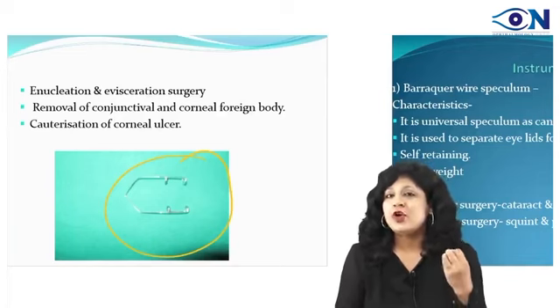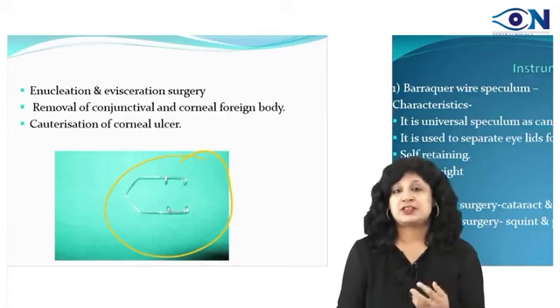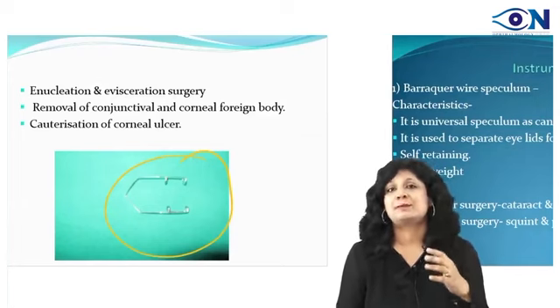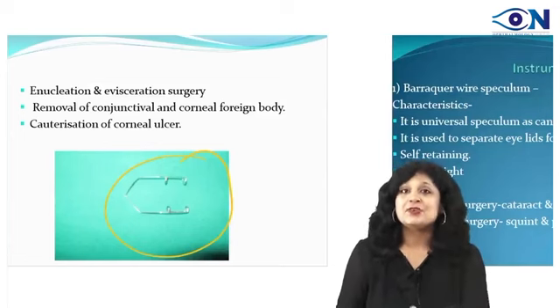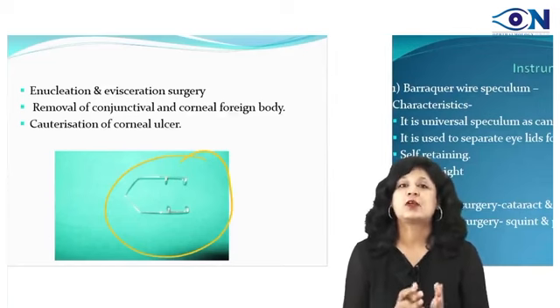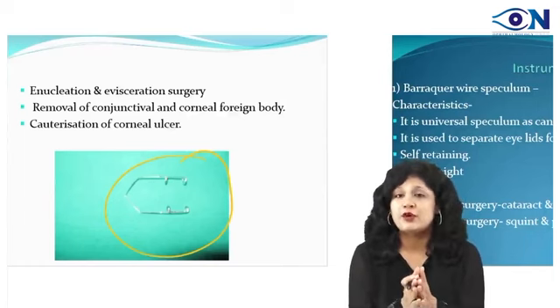Obviously there is lot of lacrimation, lot of redness, congestion, patient is in pain. So it becomes difficult for the patient to open his eye wide and let you remove that foreign body. So for that purpose we also require the eye speculum at the time of removing the foreign bodies.